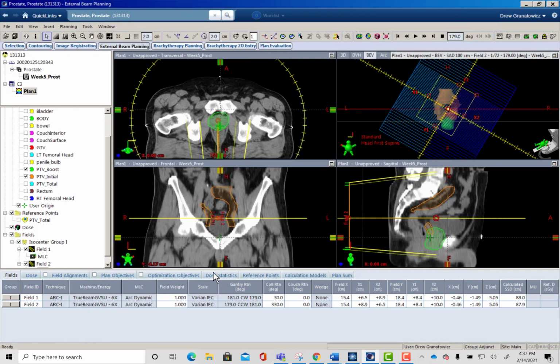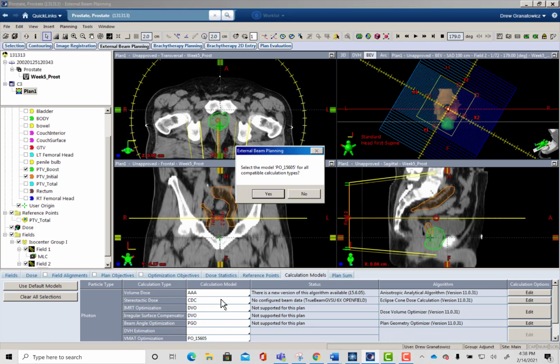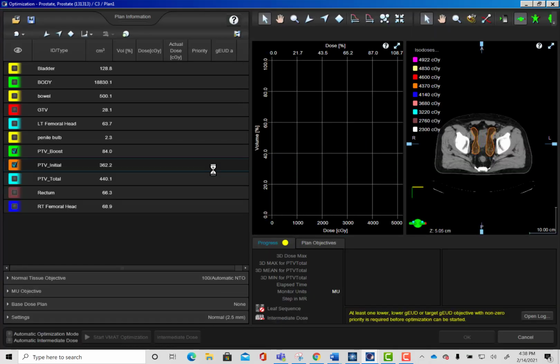So in this plan, I did not create any AP avoid, PA avoid, any rings, any of those opti structures that we talked about in class last week. If you want to use them, please create them yourself. Totally fine. And I suggest you do create them just so you can experiment with them more, play around with them more, find out what you like to use and what you don't like to use.